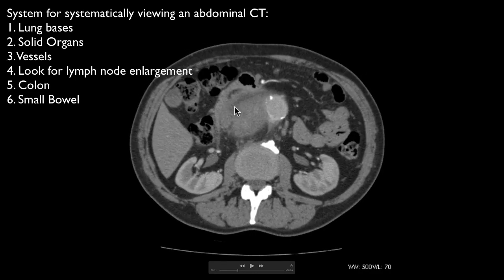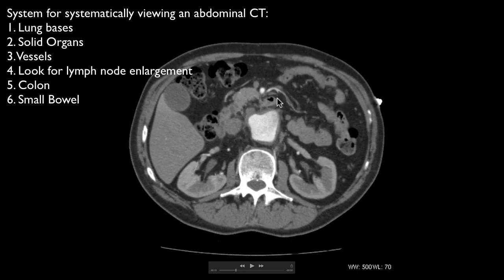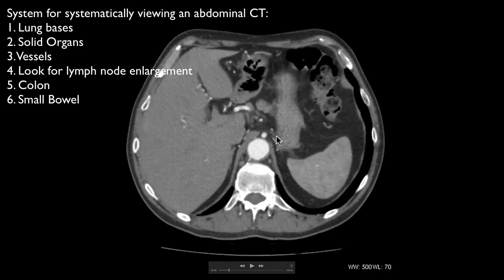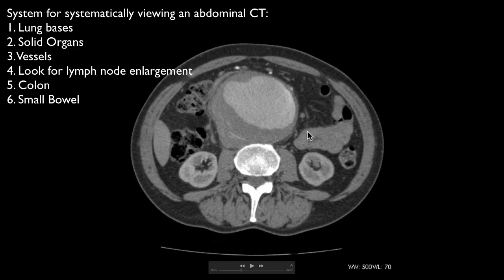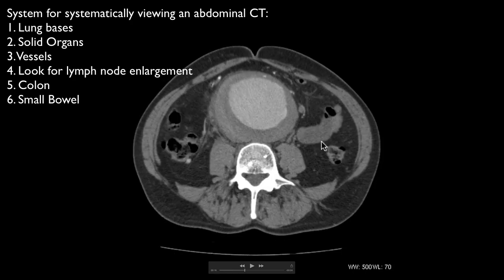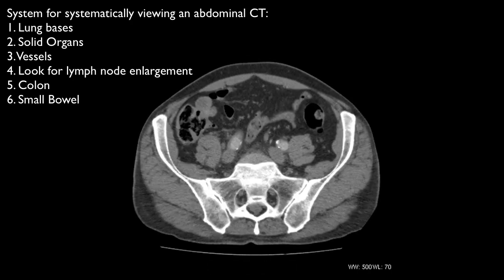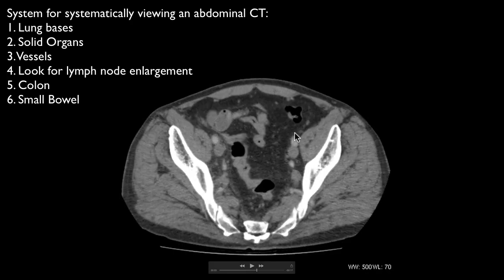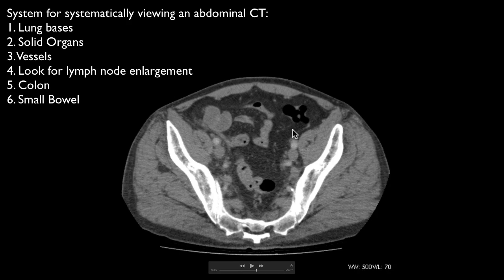In this patient, the duodenum stretched across the aneurysm before it gets to the DJ flexure, and you can see more pelvic loops of small bowel lower down. So all these are loops of small bowel which are collapsed, and that's normal appearances of small bowel on the CT. And if you're looking at that specifically, you'd have some oral contrast. Yeah, so if you're particularly looking for small bowel pathology, there are various ways of investigating that.